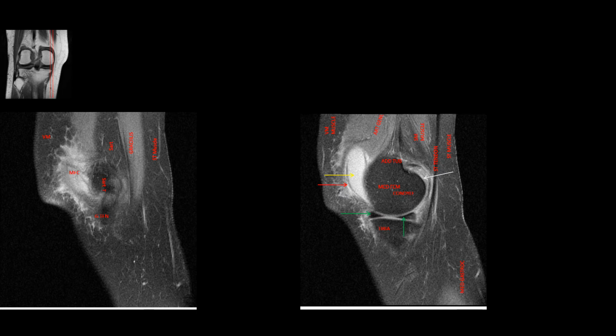And then if you go out further outside here, you can actually see your vastus medialis. We're looking at the MCL here. So you can kind of see the sartorius and things coming in to form your pes anserine bursa.